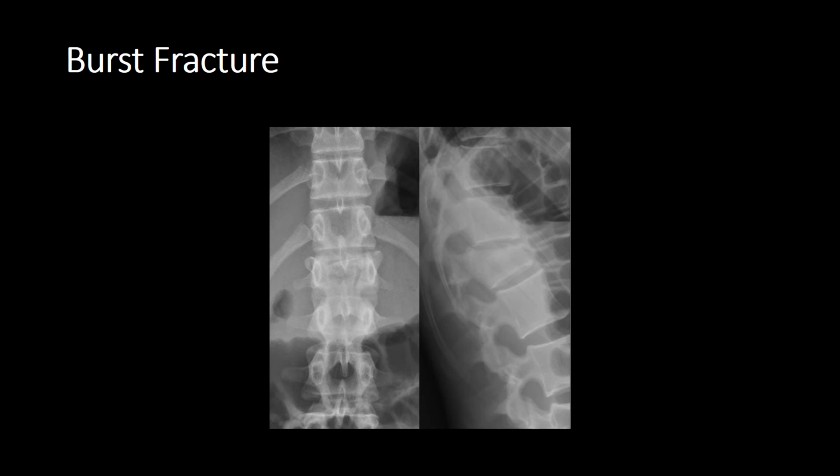You need to look carefully because sometimes you will see a small fracture fragment within the spinal canal. And as you can appreciate, it's really hard to appreciate the significant posterior elements, including the spinous processes. But we know that this is an unstable injury, and so this is a very classic appearance of what's known as a burst fracture.